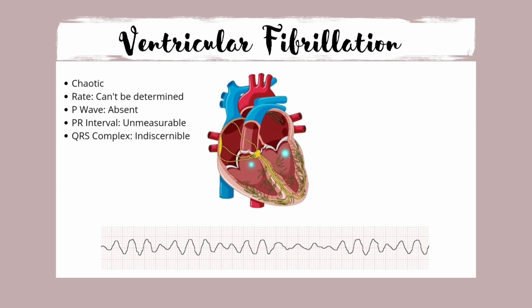Ventricular fibrillation, VFib or VF, is an abnormal heart rhythm in which the ventricles of the heart quiver. It is due to disorganized electrical activity. Ventricular fibrillation results in cardiac arrest with loss of consciousness and no pulse. This is followed by death in the absence of treatment. Ventricular fibrillation is initially found in about 10% of people with cardiac arrest.